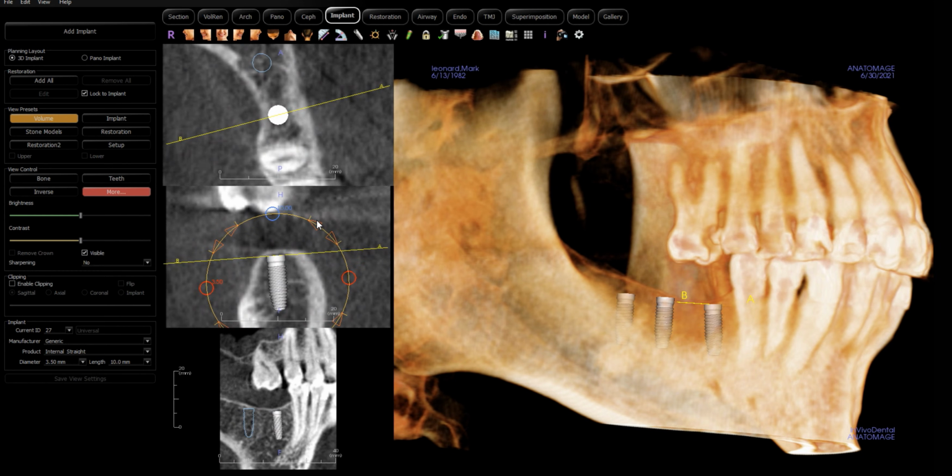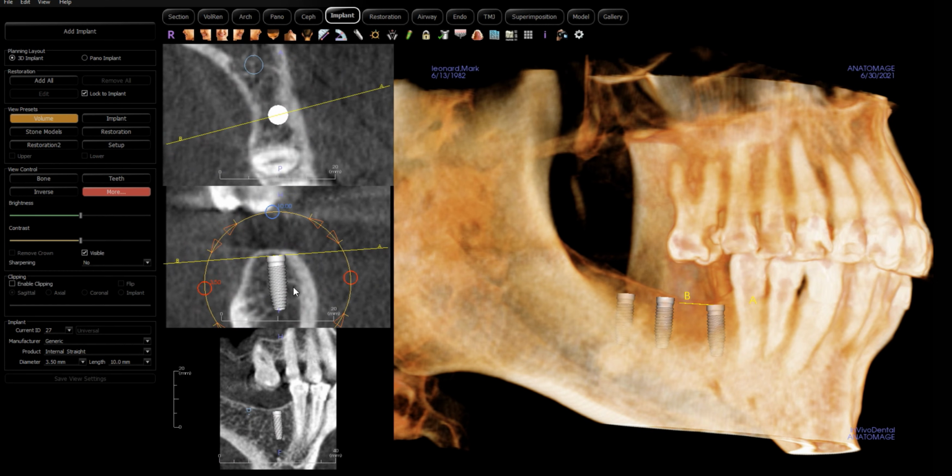And we don't have to get too stuck on this. A lot of times we can't do it because of the way the bone is. But let's just say you do that and the bone comes like this. That's when you graft. So the answer to your question, when do you graft? When you place an ideal implant and the amount of available bone that will allow you to place that implant in that position is severely deficient. Now, if we did that and there was a little bit of exposed threads on this planned implant, then maybe we're just going to move the implant over like so to get it within the bone.